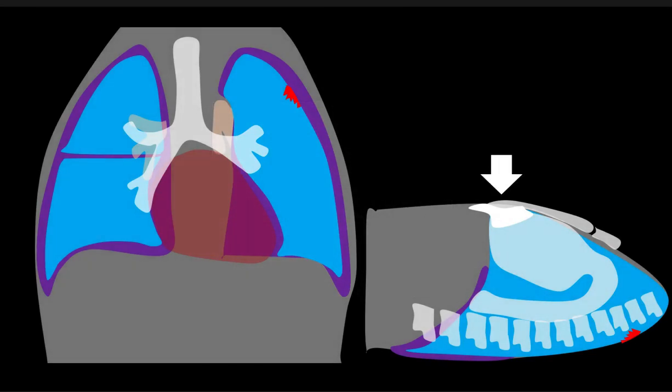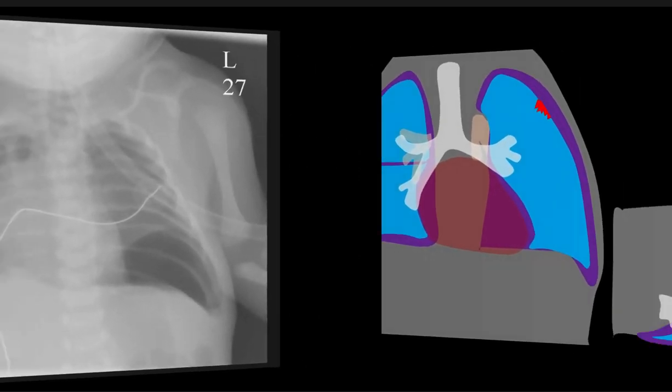And remember that some of the appearances here, we can see sort of darker there, right? Darker there. That deep sulcus, which I think we've got a little bit of going on here. So sort of going back.